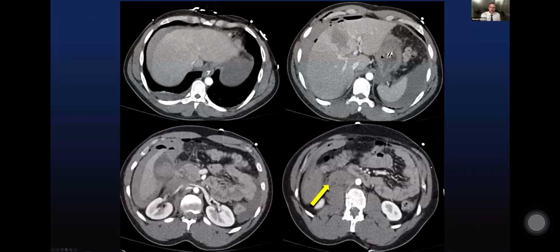This one's easy to overlook. This patient was shot through the right upper quadrant of the abdomen. You can see an extensive liver laceration, laceration going through the hilum. There's a gallbladder injury. There's an inferior vena cava injury. Very, very easy in trauma patients to overlook one of the injuries when you see so many of them. Unfortunately, they can have as many injuries as they want to, especially in blunt trauma.